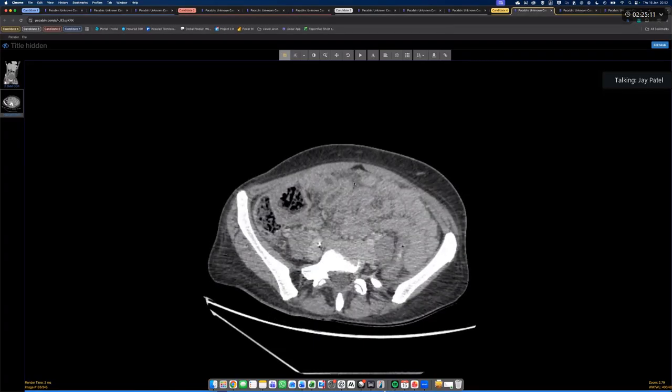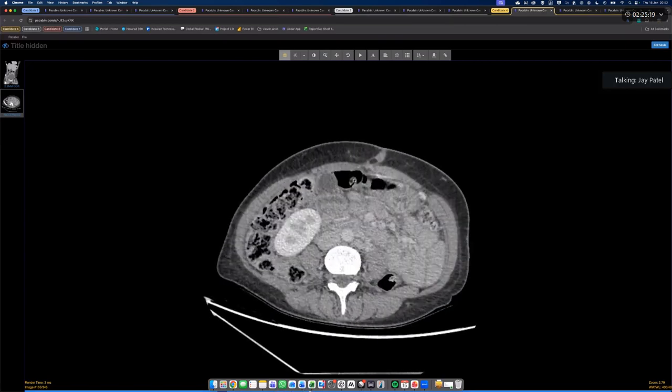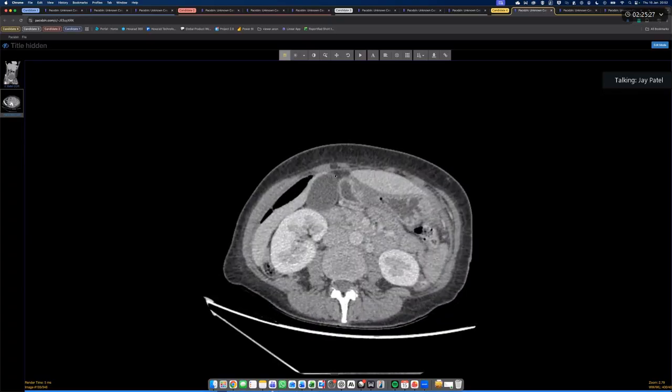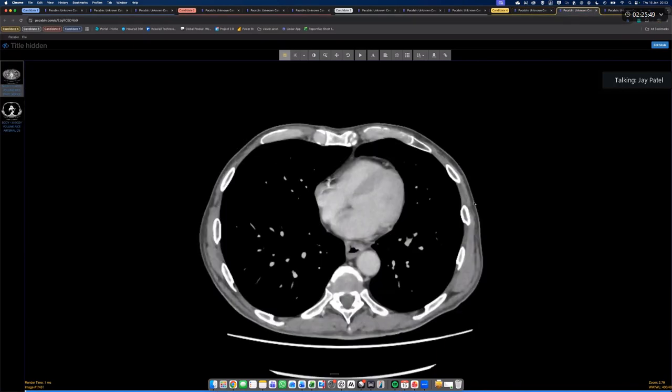And this patient has peritonitis. Generally anything tubal is open to the peritoneal space, so these patients get peritonitis quicker. So all of this additional gray is not just paucity of intra-abdominal fat and lots of bowel loops together. There's additional gray here, which is stranding in a fluid, which you rightly picked up on, and probably is peritonitis. Good, well done. Okay, next case, so tubovarian abscess.